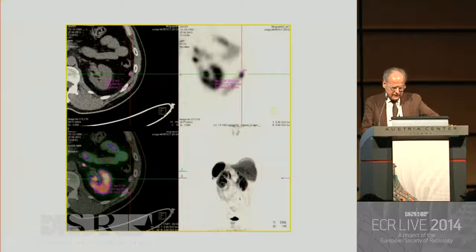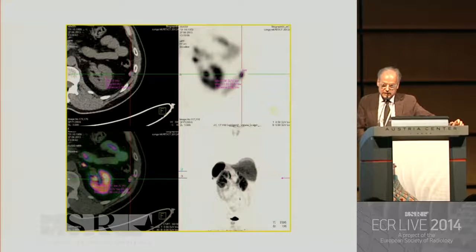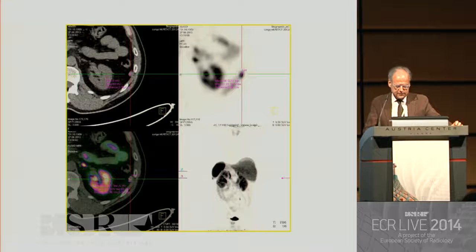So in this case, we made a different hypothesis, also because of the experience of previous cases like this, of polysplenia. So this patient probably has multiple small accessory spleens which may simulate the presence of a neuroendocrine tumor, and for this reason he was not operated and is on follow-up, but we are rather convinced that this case represents the presence of multiple accessory spleens.